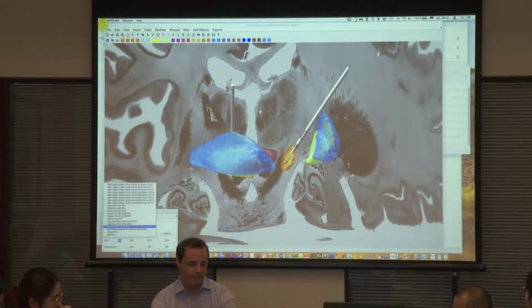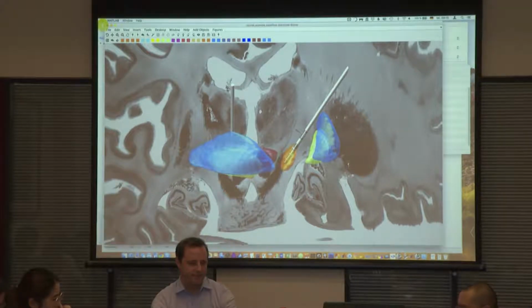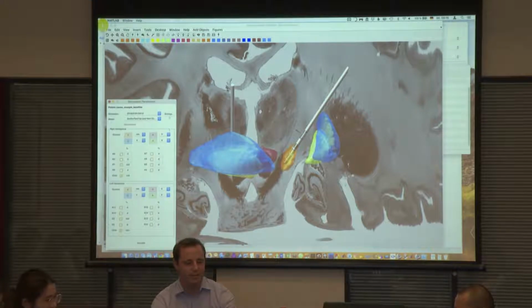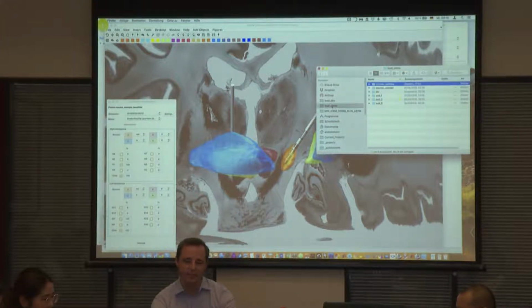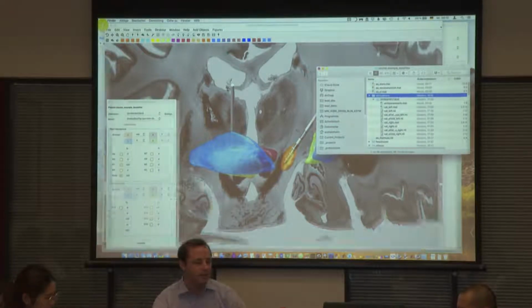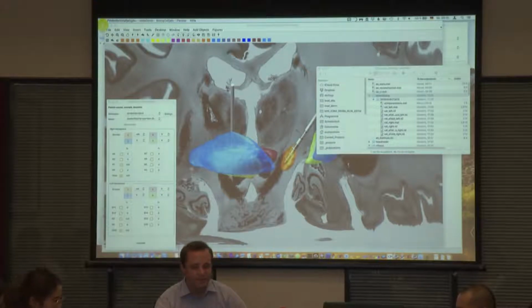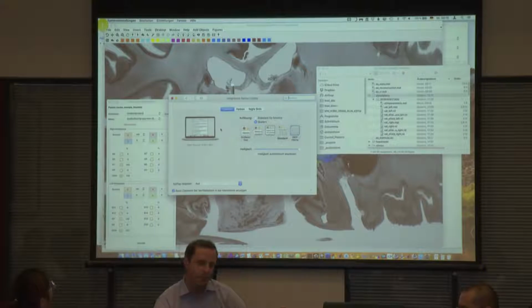Okay, and that is that. Then what Friederike asked me also to check once more, so you have the stimulations that we've created yesterday, and these are stored, so the nifti files of these are stored in a folder that's called stimulations. Wait a second, I'll make my screen size a bit bigger again, so you can read.